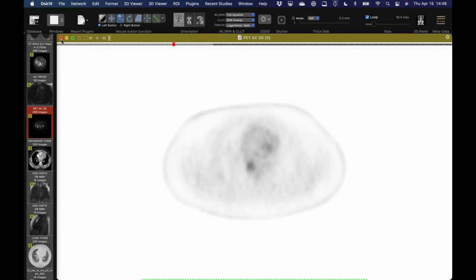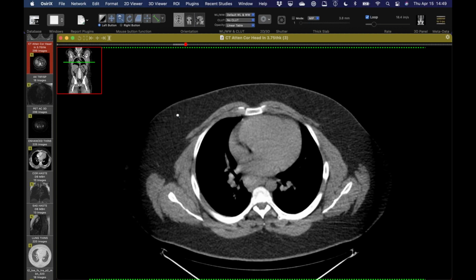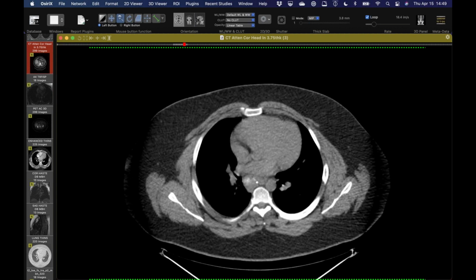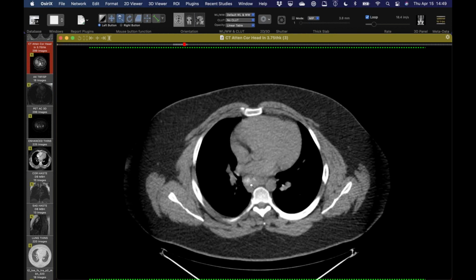Anyway, it just showed some heterogeneous enhancement, but some areas of low signal in the lymph nodes suggesting some degree of necrosis, which I'd not be surprised if this is a granulomatous inflammation. And the PET CT is kind of nice because it illustrates, here's the MIP. You can see there's a lot of uptake in the lymph node, and there was really no uptake in the lung.